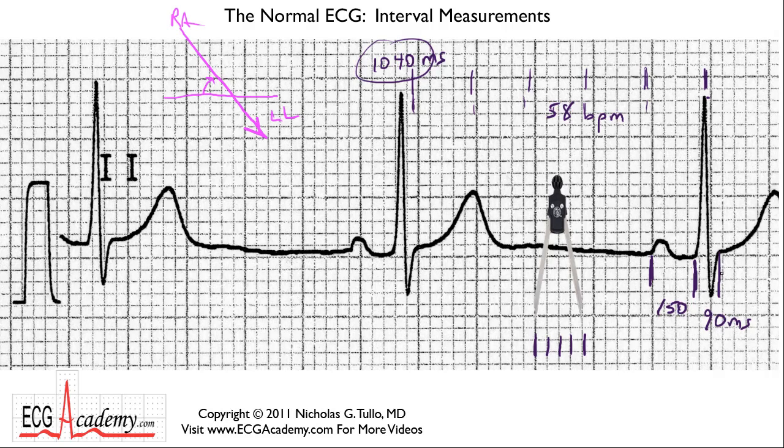Now, let's look at another QRS complex just to double check because, after all, there are a couple here. You can see the QRS ends just before the heavy line, and it starts just before this light line. So you have 2 boxes almost exactly. And here as well. I think perhaps on second thought, this is probably more like 80 or 85 milliseconds.